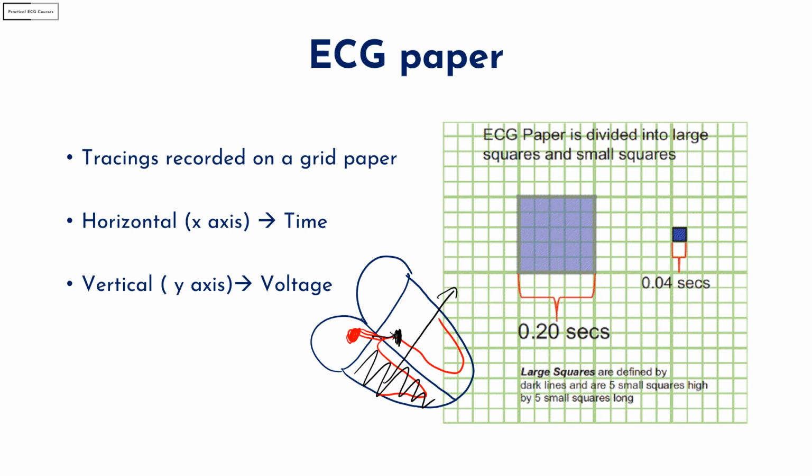The point that I wanted to convey is that the width of any deflection or interval on the ECG tells you about the time taken for the electrical impulses to conduct across it. So when there is more time taken for the conduction, the deflection or interval becomes wider, like in the LBBB. Now another example is AV blocks. In AV blocks, the AV node is diseased and therefore conduction across the AV node takes more time. And how is this manifested on the ECG? By a prolongation of the PR interval.